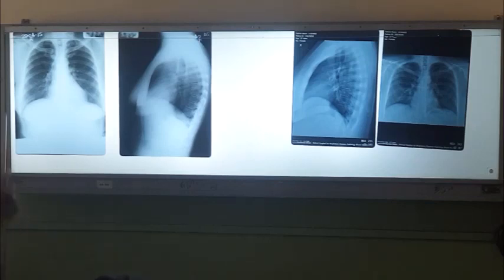So you will see bilateral opacities and all because of the congested vessels. Ideally the patient is not having any inflammatory change, but you are thinking of inflammatory shadows because of poor inspiration. And the cardiac contour might get altered, so you might think of cardiomegaly also, right? So X-rays should be done in deep inspiration.